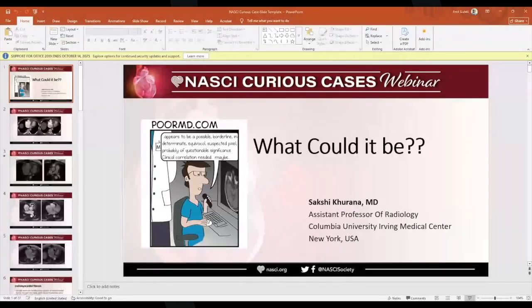So since this is a curious case webinar, I wanted to show the cases that came to us with diagnostic dilemmas, and we were thinking, what could it be? Is it a tumor? Is it a thrombus? What is it? What is going on?